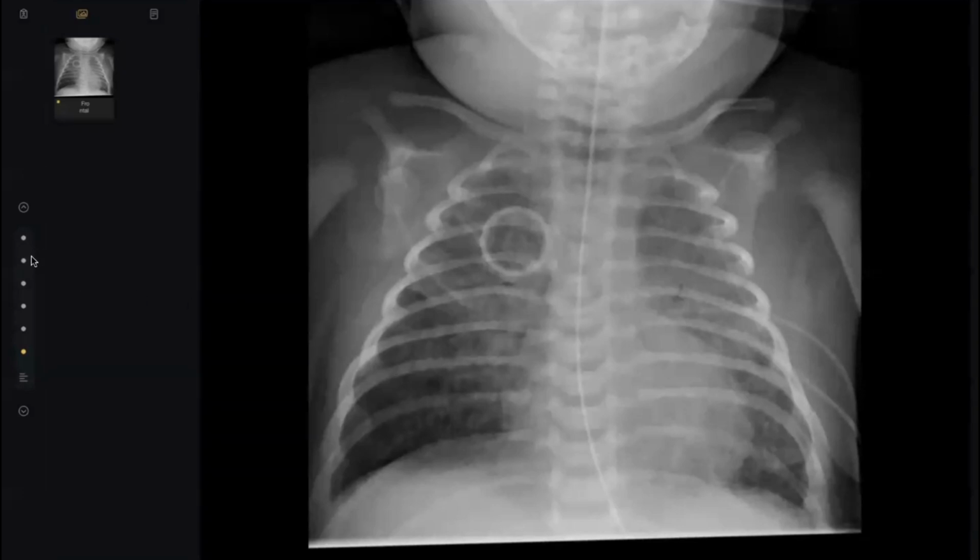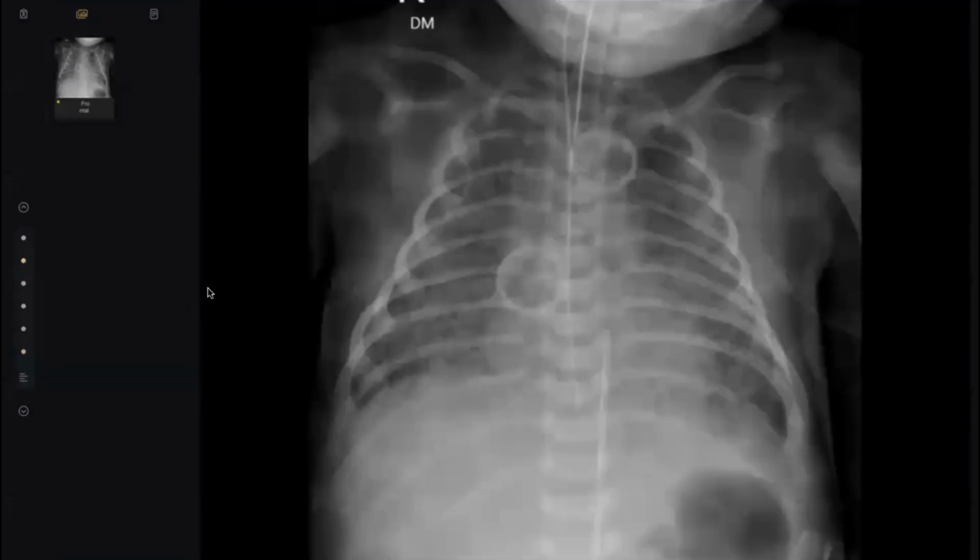If any candidate said this is granular and gave respiratory distress as a differential, it is accepted. Except, why? Because this X-ray does not contain all the criteria of meconium aspiration. However, after I tell you this is obstructed labor, meconium aspiration should be on top of your differential diagnosis list. Thank you, doctor, so much. Next candidate.